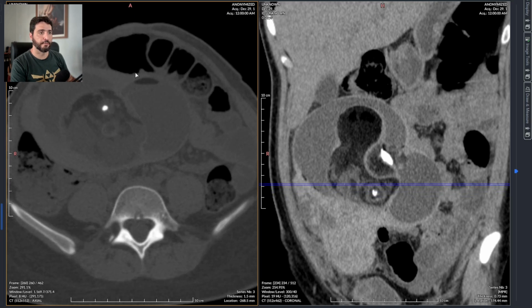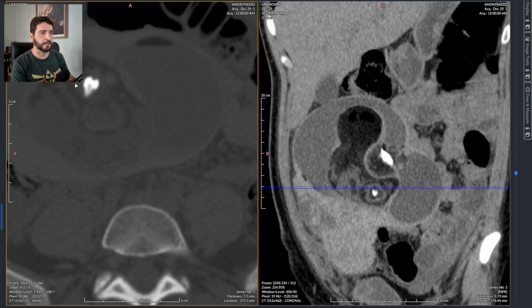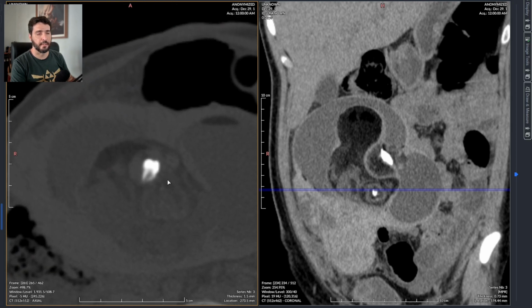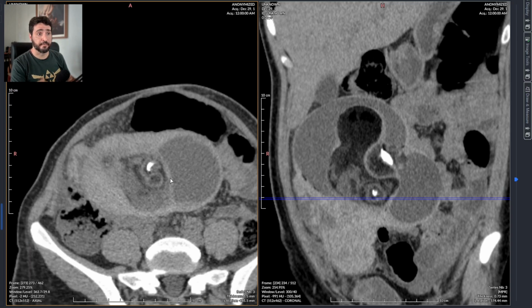And if you are very careful and experienced, you can readily see that these calcified features have a very distinctive shape. This looks so much like a tooth. This is a tooth shaped calcified lesion. This is actually a tooth because this is a classic cystic mature teratoma, also known as a monstrosity, a monstrous tumor.